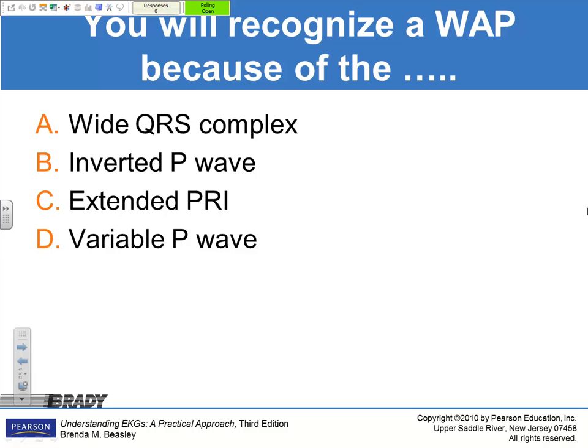All right, let's see. You recognize a wandering atrial pacemaker because of the... there's only one correct answer here. Like registry, one is right, really right. Yeah, one's more right.